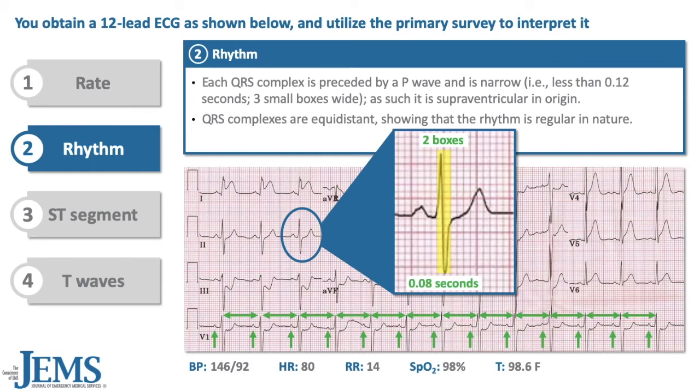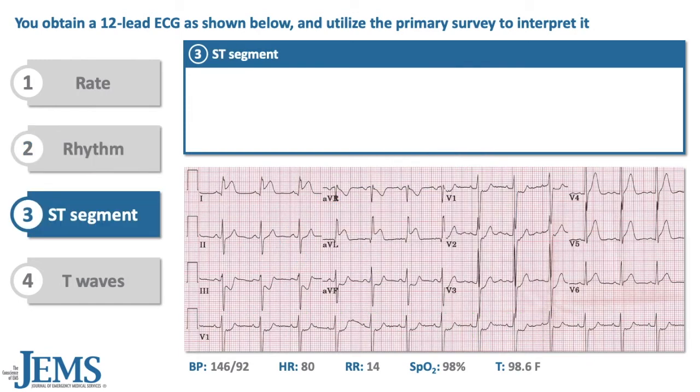Because this is a supraventricular rhythm in a patient with stable vital signs, no intervention is necessary regarding the rhythm at this time. However, if this were a ventricular rhythm, you must be prepared to intervene immediately following ACLS guidelines should the patient's condition deteriorate. For example, if there was a drop in blood pressure, or the rhythm changed to ventricular tachycardia, or worse yet, to sudden ventricular fibrillation.